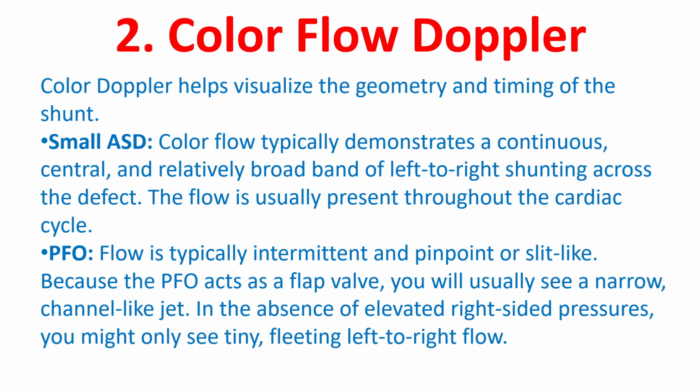PFO: flow is typically intermittent and pinpoint or slit-like. Because the PFO acts as a flap valve, you will usually see a narrow, channel-like jet. In the absence of elevated right-sided pressures, you might only see tiny, fleeting left to right flow.